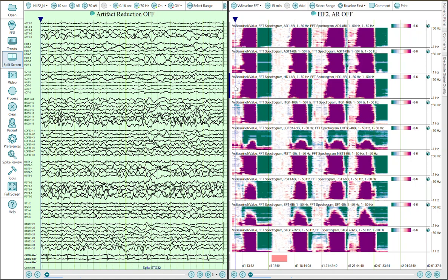But if you're going to do trends on channels looking at even much higher frequencies, which you can do, and you want to get around that issue where you tend to have a lot of power in the lower frequencies and very low amplitude at higher frequencies, because these are showing z-scores, normalized z-scores, based on an empirical null that was marked here. I just happened to put it there. Then you get around that problem of having a lot of bloom in the delta range, and you miss out seeing what's happening in the beta, gamma, and so forth ranges. So that is just a quick view of that.